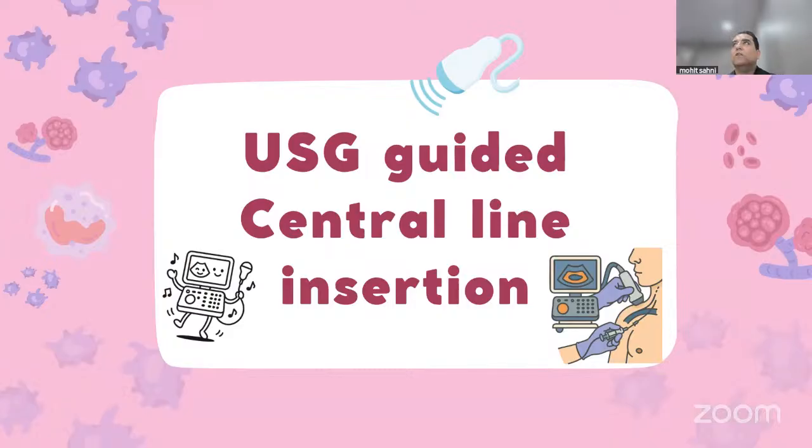Okay. So now USG. That was how to identify the UAC and UVC, and then how to identify the ET tip. These 3 things we have already discussed, because these are the most common ones we put in our babies. Then the PICC lines, I told you, if you put it in the lower limb, it will run through the IVC, and the tip can be localized in the IVC and at the IVC and RA junction. And if it is from the upper limb, then the tip has to be localized at the SVC and RA junction.